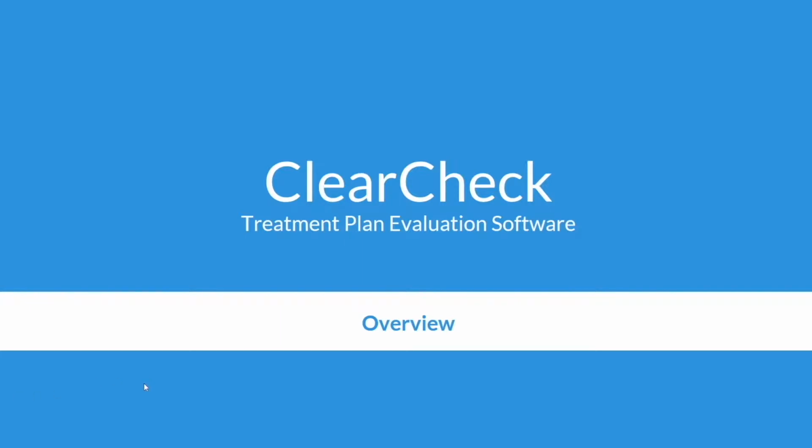Welcome to an overview of ClearCheck. ClearCheck is a plugin script that runs directly inside the Eclipse treatment planning system.